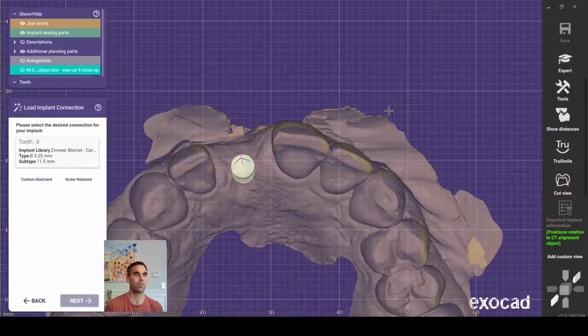So this is a follow-on video on how we would do this if we had a pre-op. So let's say that planning was already done, maybe during implant planning, and now we wanted to bring that pre-op in and use it to help us do the mirroring. So I'm going to show how to do that.